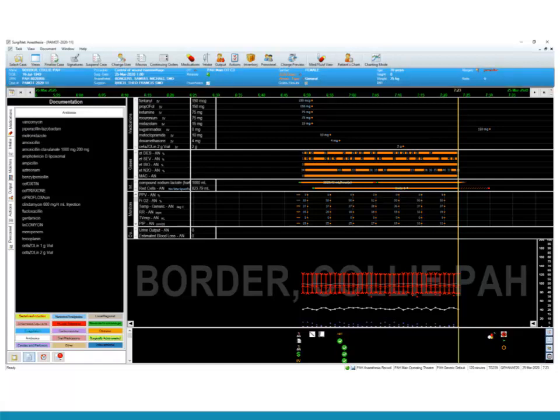In addition, the banner bar enables the review and management of allergies that will display what is recorded in PowerChart, and also provides an opportunity to update this list. You will notice that the Finalize Case button is available to select and that the patient's name is displayed on the anesthetic grid. Continue to document the case and then finalize when required.